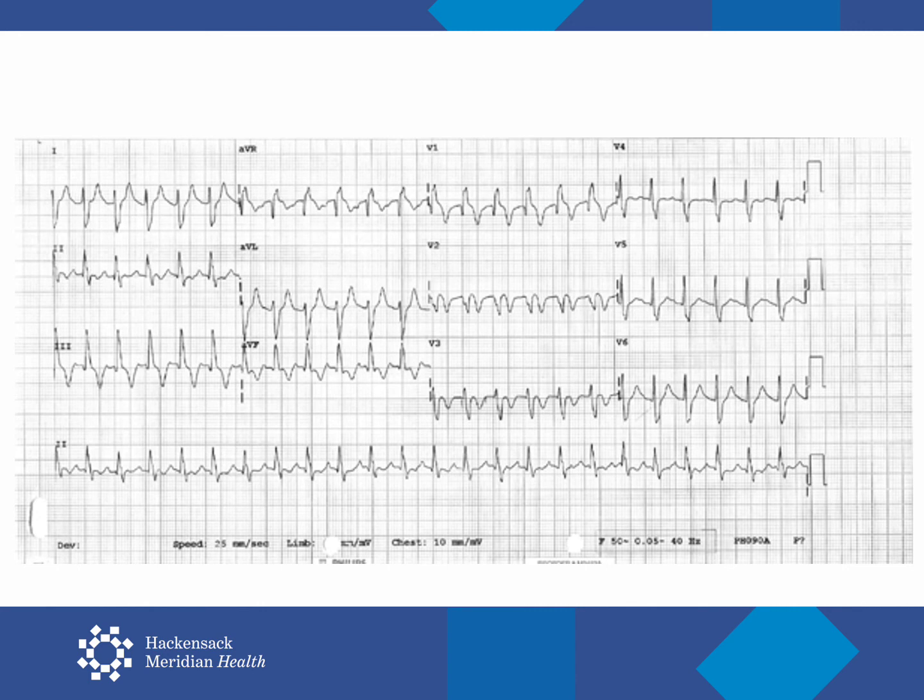You see a deep S in lead 1, and there's a deep T-wave inversion in 3, as well as a small Q wave. There is clear right axis deviation. So consider these findings together and look at the tracing. This is an S1, Q3, T3, right axis deviation, right bundle branch block, and right ventricular strain. This is an acute, hemodynamically significant, most likely, pulmonary embolism.